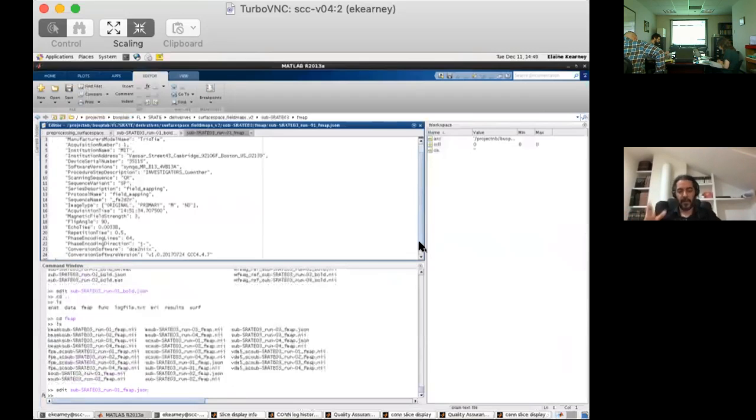But they have their own convention of how to call that. They call this X, Y, Z directions for the 3 directions of the data that have been acquired. So X should be the frequency encoding direction, Y should be the phase encoding direction, and Z should be the slice selection direction. Well, they have their whole thing. So if you can figure out, I'll try to do this myself as well, but if you can try to figure out the relationship between these J plus, J minus, this would be something like IJK, or the 3 directions in the DICOM lingo, and then plus minus tells you the direction of this thing.